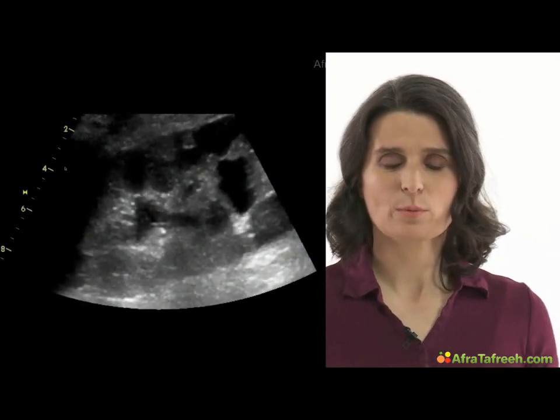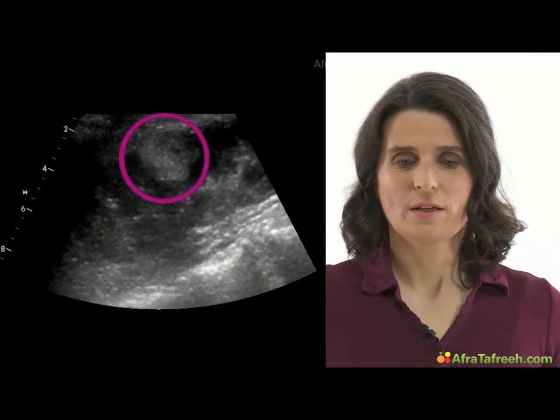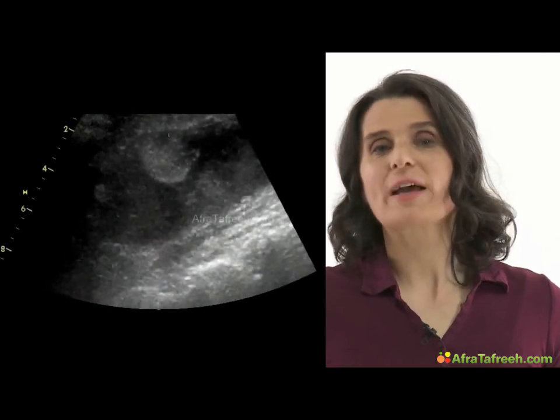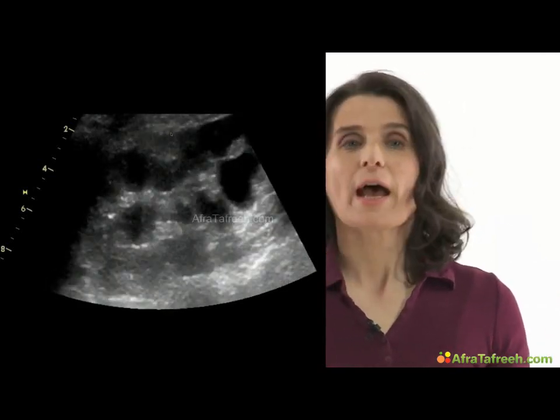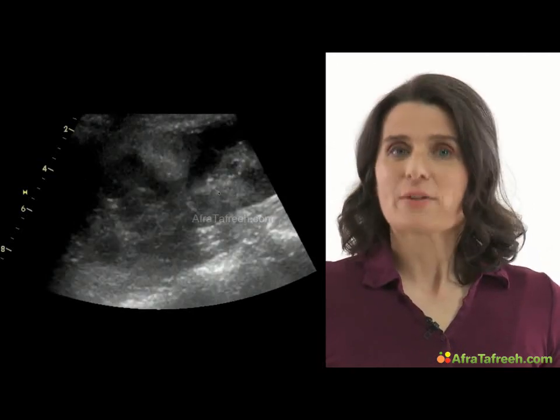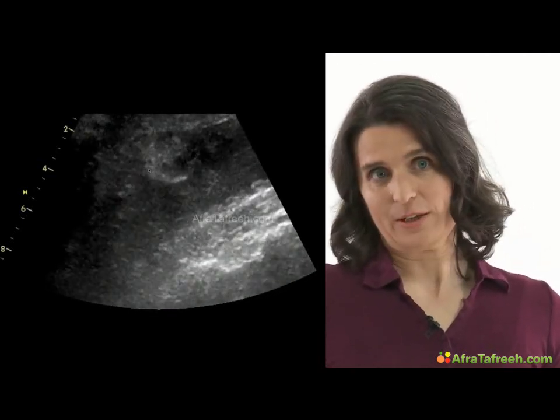This is another one. I want to show this to you because in this case, it's hyperechoic, well, but there's not clearly defined borders over here. We performed a CT in this case, and it was a normal angiomyolipoma with no signs of malignancy, but just from the ultrasound picture, it was clear that this lesion needed further diagnostics.